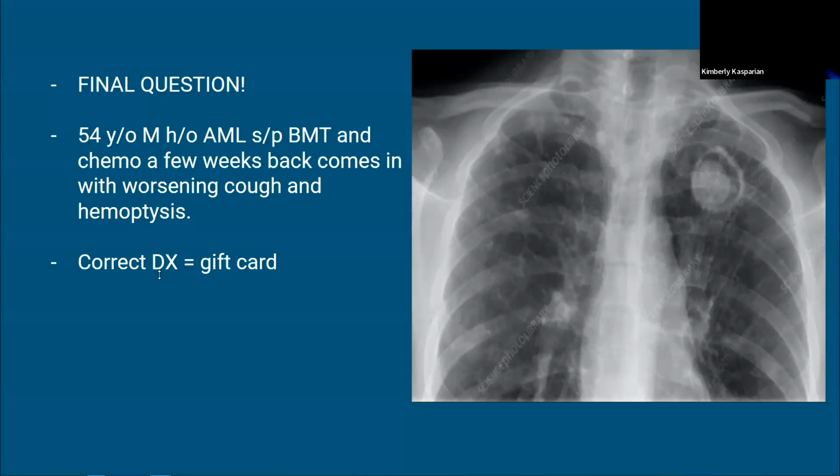Anybody from the chat? Offer it up? Plasma? Oh, that's a good thought, actually. Check on the chat, make sure no one's typing in. Yeah, cavitary lesion. Okay, it is a cavitary lesion with something in it. Not PTLD, but good thought. Anybody can guess.